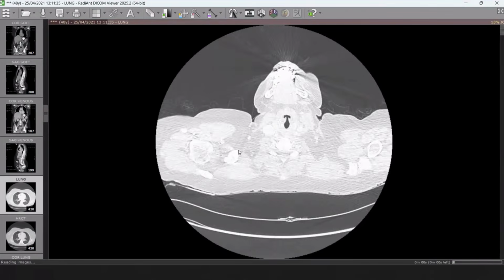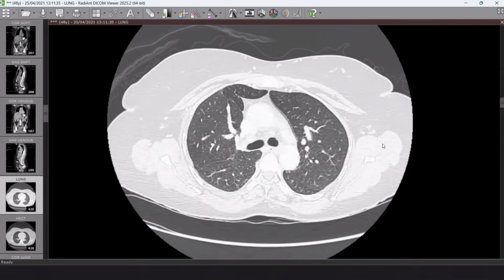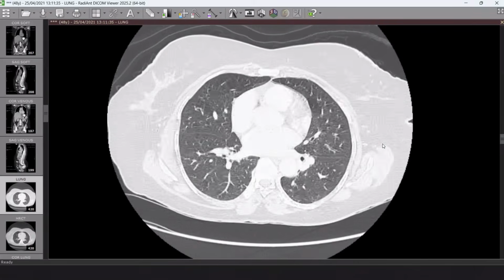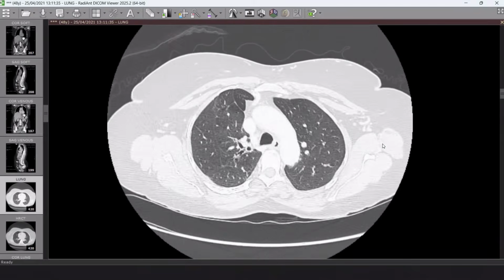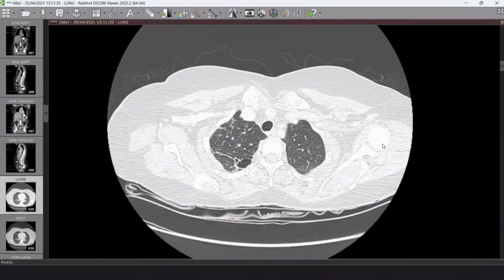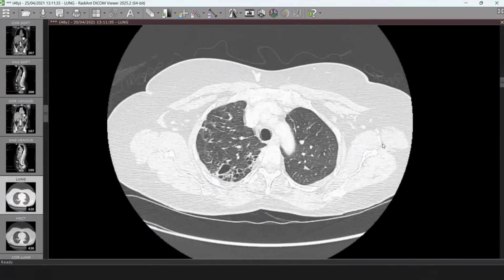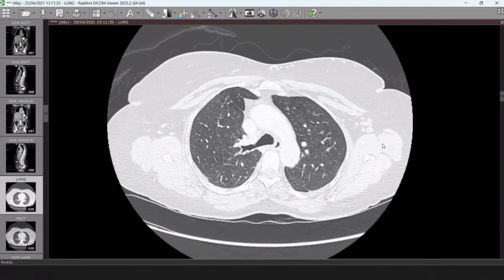Okay, can we check the chest lung window in the axial slices? I would first scroll through the images to orient myself, and then I will explain the findings. Can we focus on the right upper lung lobe to save time for the others? Sure. I can see that there are reticulations and fibrotic changes. Yeah, you are right. Paraseptal emphysematous changes or cicatricial emphysematous changes in the right lung. Yes. And there is architectural distortion. So there are predominantly fibrotic changes and paraseptal emphysematous changes.